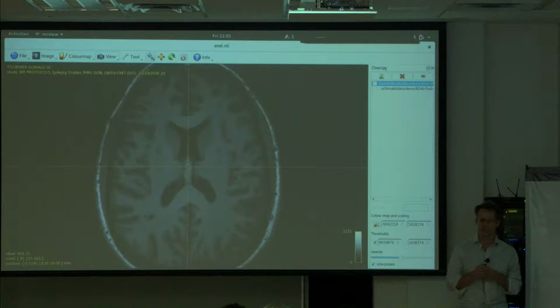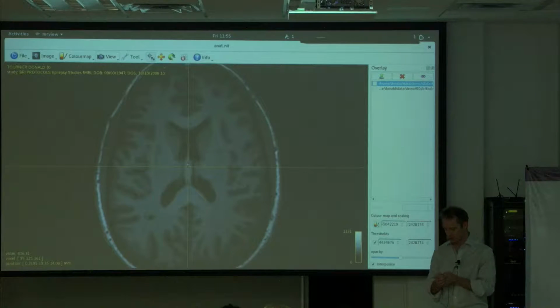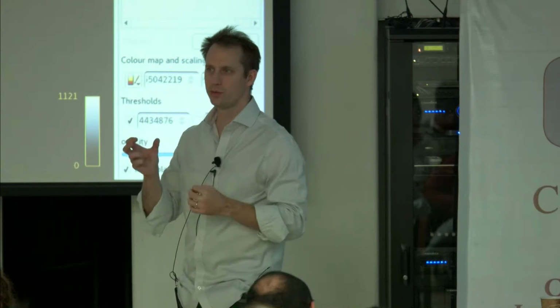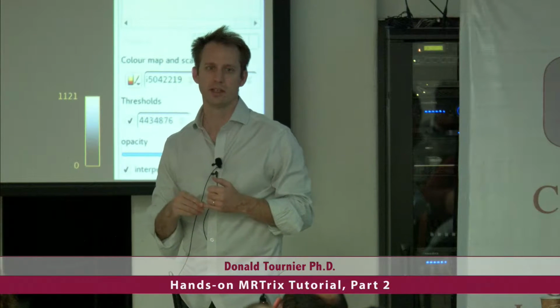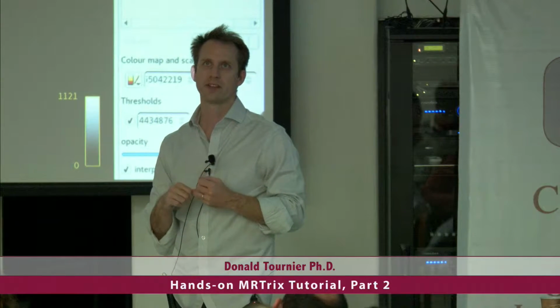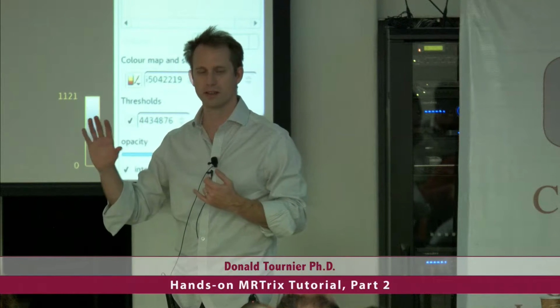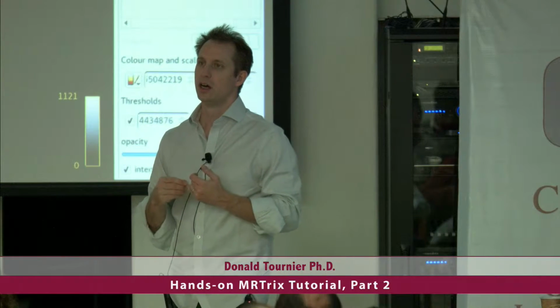But I realize that it's not everybody's cup of tea. So it runs just fine on the other platforms. Windows has a few more glitches in there, but they're mostly about compiling the software more than anything else. Once you get over that, things seem to work pretty well.